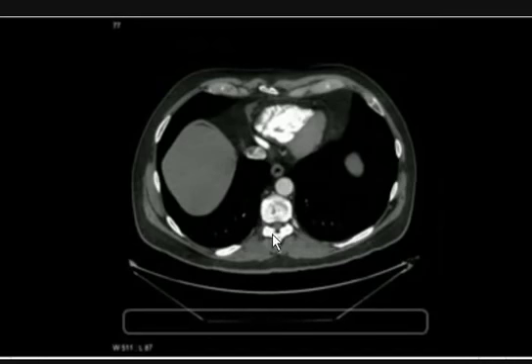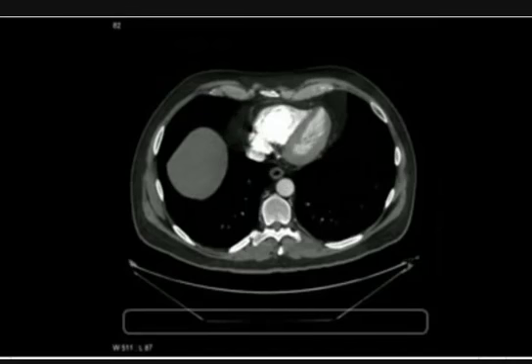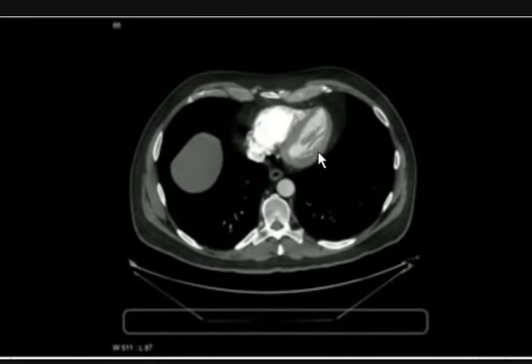esophagus, descending aorta. Some liver is still visible through the diaphragm. Okay, now you're beginning to see the contrast in left ventricle here. This is septum. Heart lies oblique in the thoracic cavity, not straight. So this is myocardium, the left-sided myocardium. The walls are quite thick, as you know, as compared to the right side of the heart, which is normal.